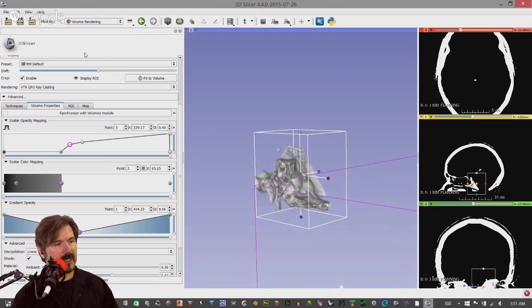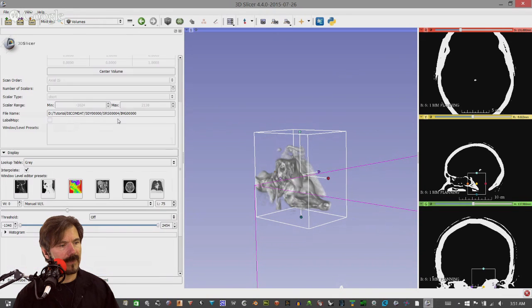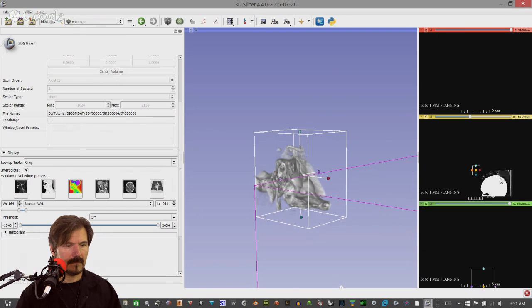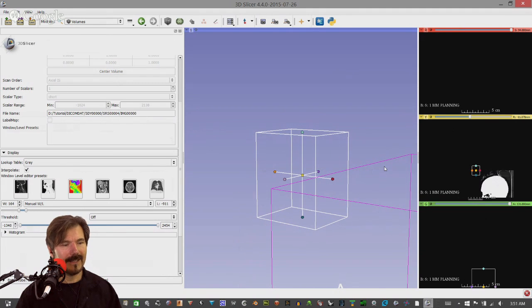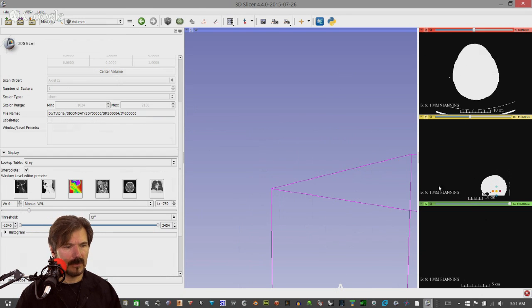All right, so let's say we want to do the same thing, and we'll very quickly go through there. The first thing you need to do is make sure your volume is set up correctly. So we'll center it. No, that was not good. It took me out of where I wanted to be. All that work for nothing. It's okay. Oh, well, but I wanted to print this out, so let's go back and there, move it all into the plane.